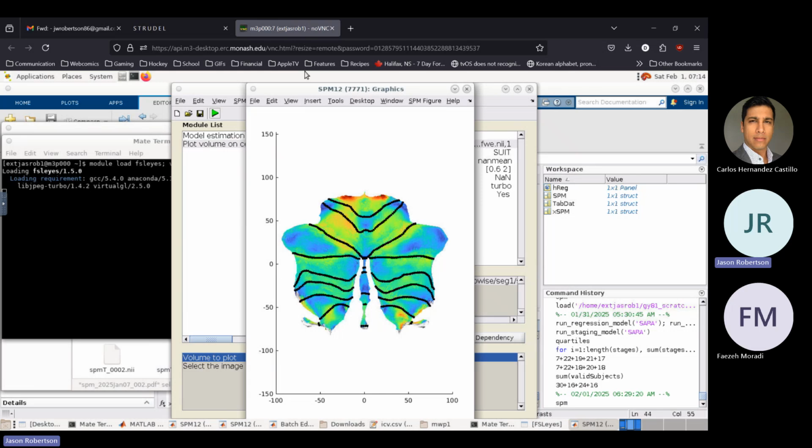So what you would see in this one is that we've got our strongest effects in lobules 1 to 4, and weaker effects here in crus 1 and 8B, and in the vermis. That can help you anatomically identify where your effects are happening. This is something you can also save, crop, and put into figures.